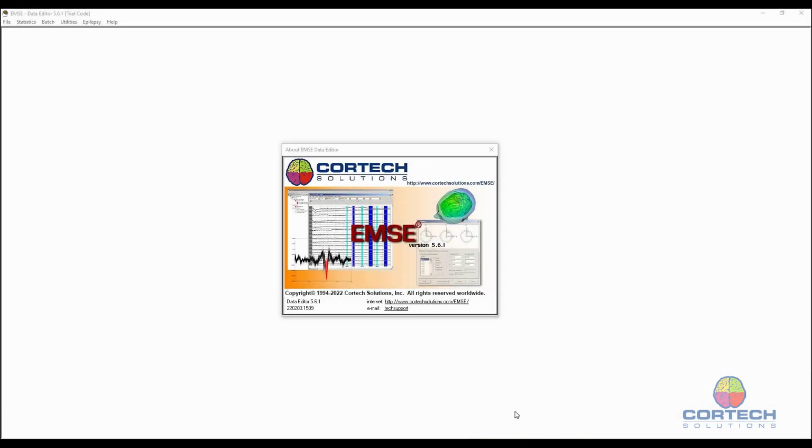Here's a video on setting up a processing pipeline for the two data sets that you acquired with Lloyd. By the way, I'm going to be using EMSE version 5.6.1.